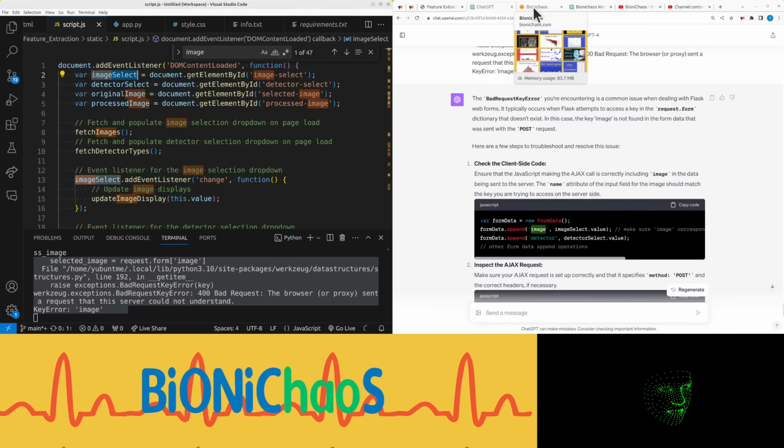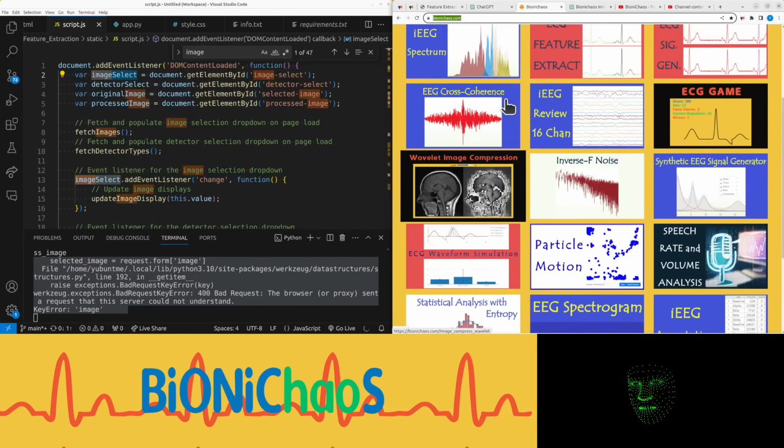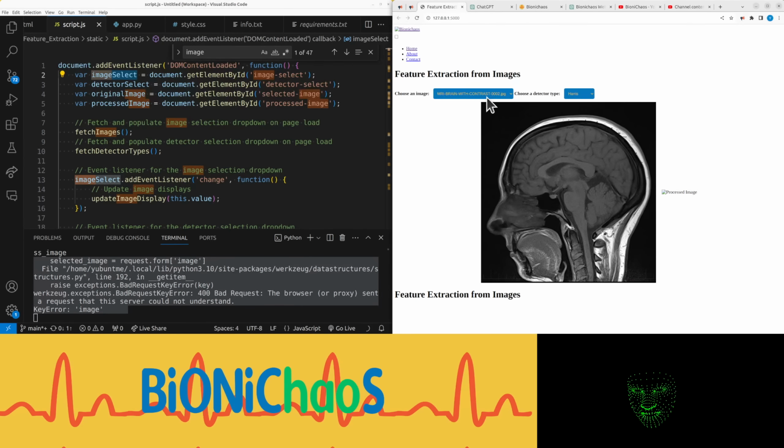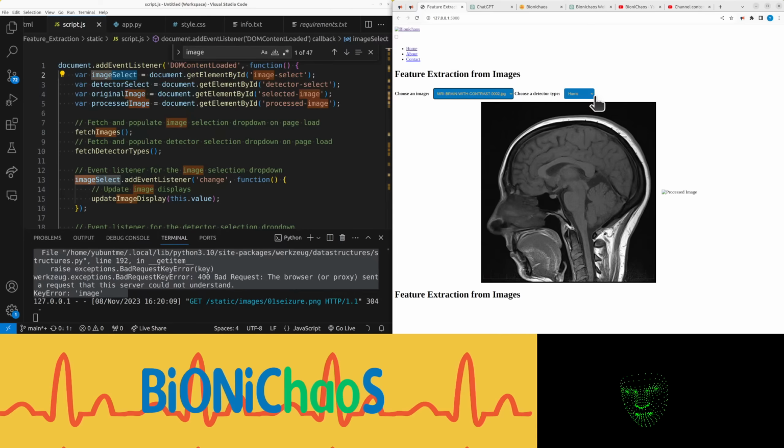We will deploy this hopefully in a bit. You can see there would be deployment of all the other tools on the site in previous videos. Hopefully we'll be deploying this one, well, once it's working. And for it to work, we need it to actually show a processed image. Just getting some errors at the moment.